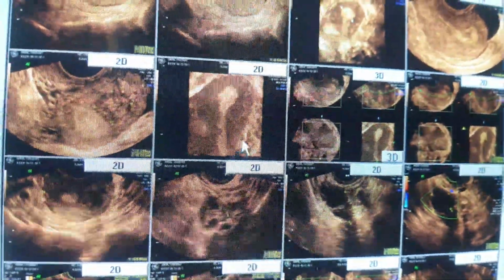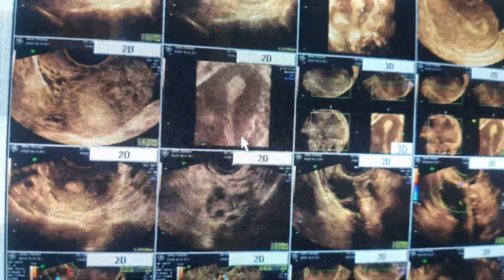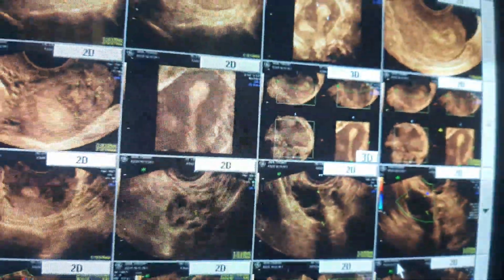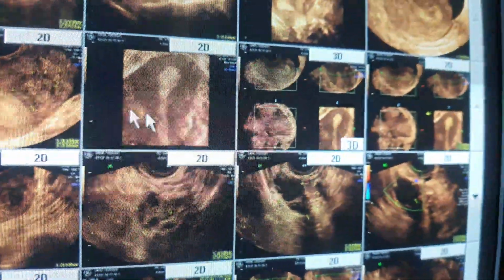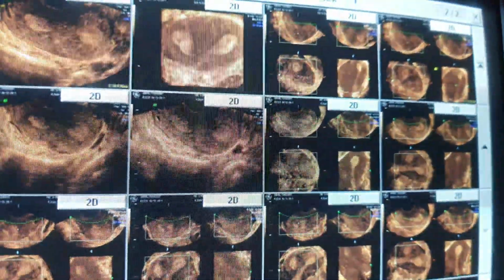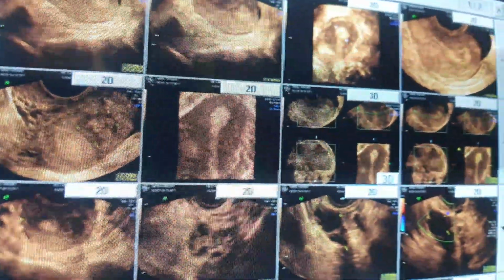As I told you at first, you look at these different pictures, of the ovaries, of the Doppler or whatever, but as you can see here, you may think that that's just a unicornuate uterus, while it's not actually, it's not that diagnosis. Rudimentary horn. Thank you.